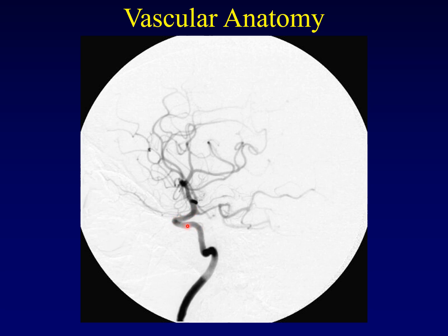And you can imagine that if you were looking at this artery from the front, it would just look like a circle. You'd be seeing it head on. And that's what we saw in that last slide. We saw the internal carotid artery seen head on as it's coming straight towards you, then turning around and headed straight back again. So why don't we always look at the internal carotid artery from this perspective?